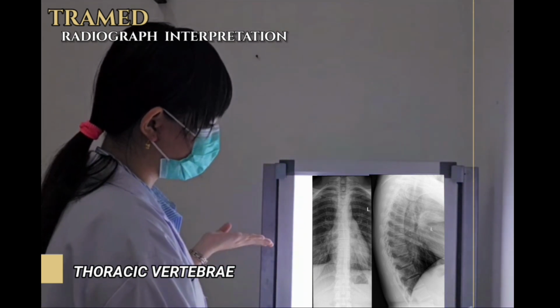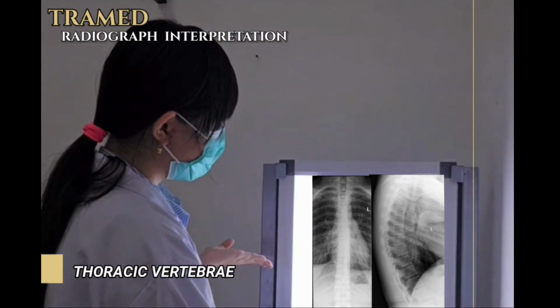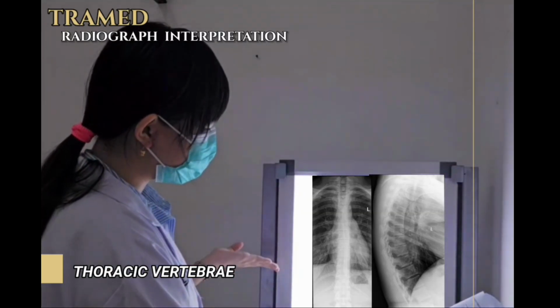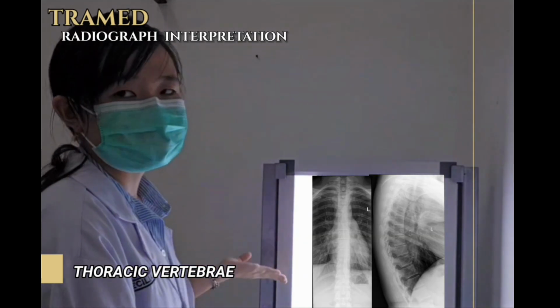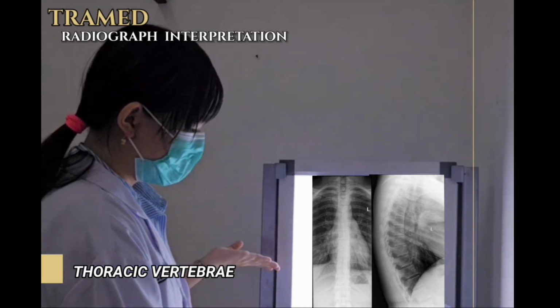And for the next, we must check the access finding, the thoracic AP or the lateral. First, the vertebrae T1 until T12 are visible, and the next, the alignment and also the curvature are normal. There is no listhesis. The listhesis is absent, no anterior or posterior listhesis.